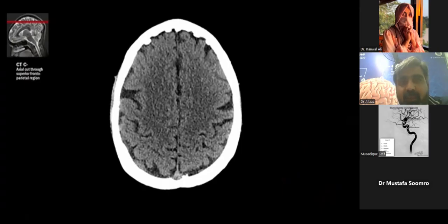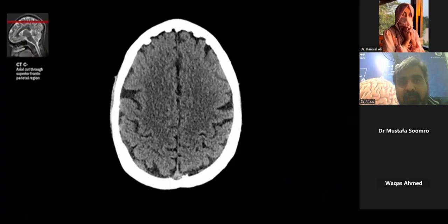Yes, sir. I am Dr. Mustafa, sir. I am telling the landmarks. Pars marginalis is present in the midline, straddling the midline, just posterior to the maximal biparietal diameter, and the central sulcus is going posteriorly towards the pars marginalis. Just at the pars marginalis, there is the paracentral lobule, and the central sulcus is going towards this side.